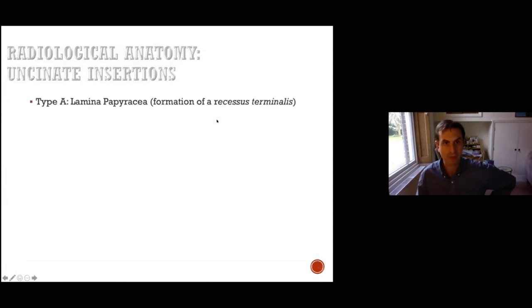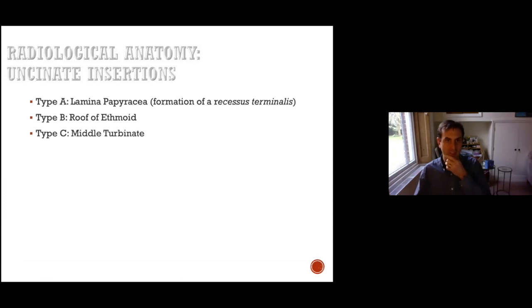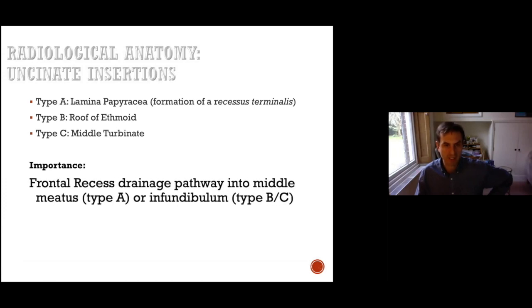So the next thing we want to think about is the uncinate process, and that can attach in one of three ways to either the lateral wall or the skull base. And there's a reason that that's important, because it affects the drainage of the frontal sinus.